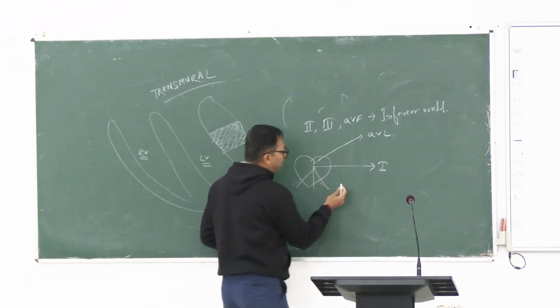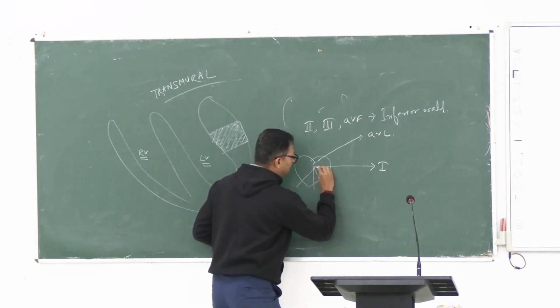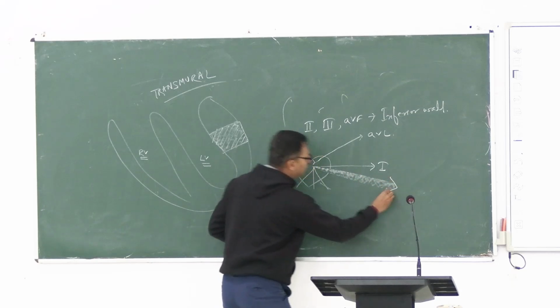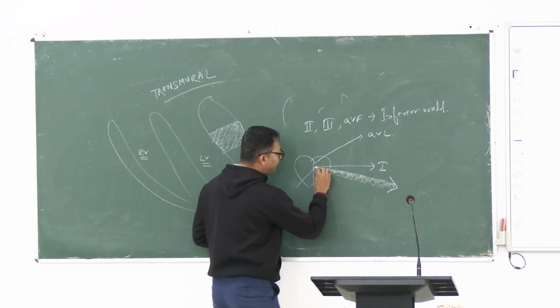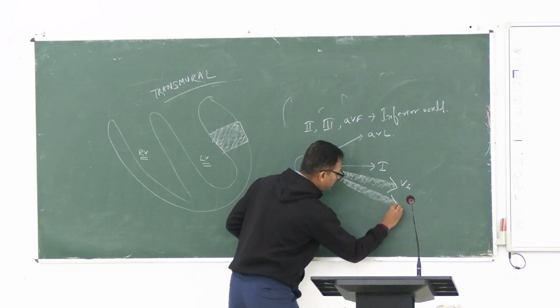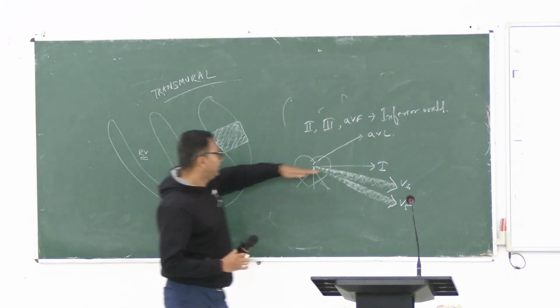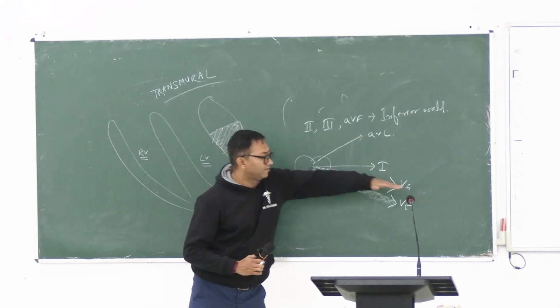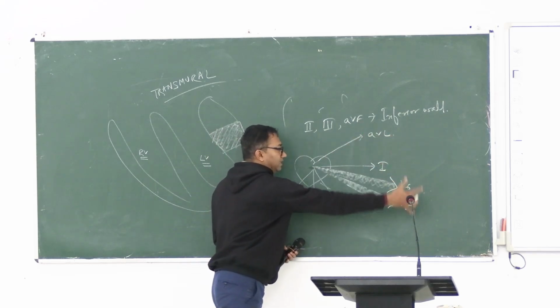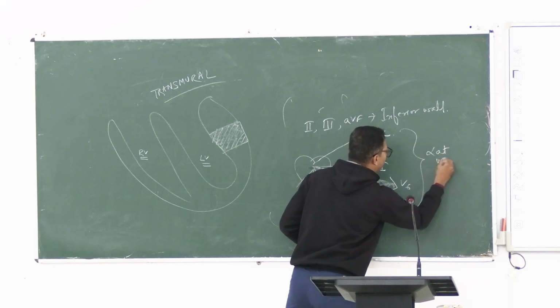So if I have to keep it three dimensional, it will be like this, as if this is coming out in front and that one, right? Okay. So this is lead V5, V6 and V5, right? So lead 1, lead AVL, lead V6, lead V5. So all these are the lateral wall. Okay. So these denote the lateral wall of the heart.